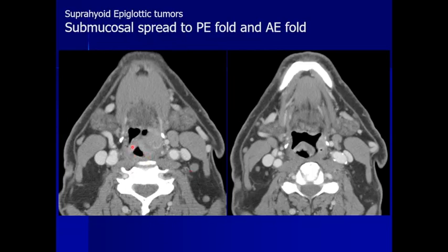As you go more north, you can see that the whole suprahyoid epiglottis is abnormally thickened, especially the left side, and you see this bulky tumor making its way laterally. More cephalad, you see the infiltrated tumor of the suprahyoid epiglottis. You have air gap and you have tumor in the left lateral pharyngeal wall. Well, this can't be seen endoscopically, so we know that this is submucosal extent.